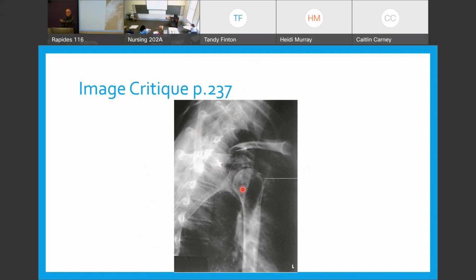Remember, you have to look at the affected arm and bring the other arm up. We did this in lab Tuesday. You'll do it in lab today. Remind me, this is your favorite. All right, and what method was it? Lawrence, all right. And the rest, we have two options here. We can do what? For respiration.